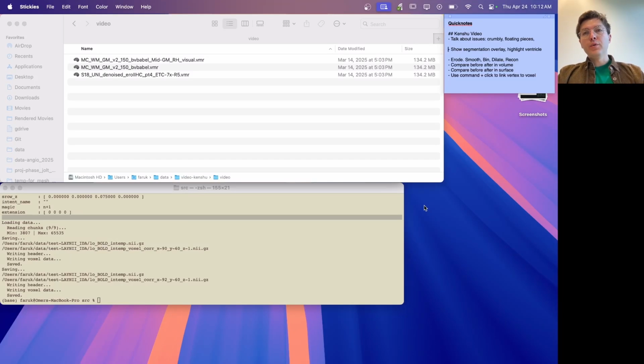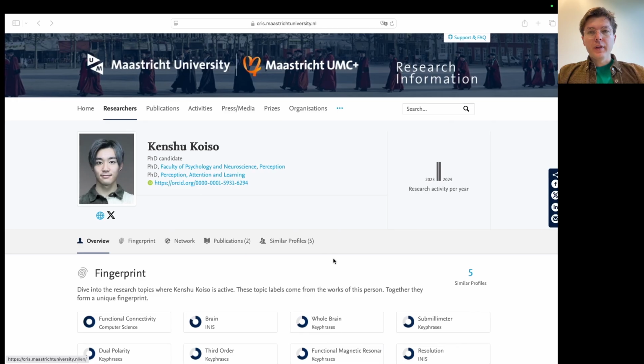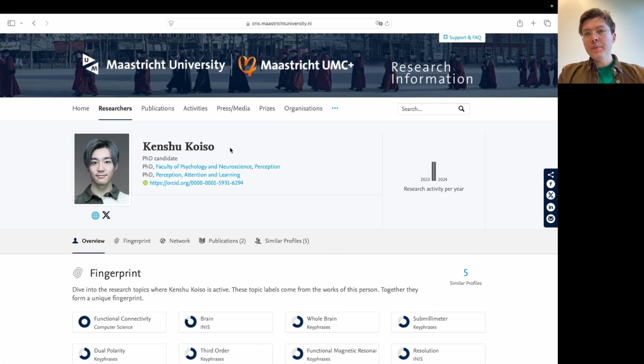Hello, today I'm going to talk about how to create a smoother looking mesh from a segmentation in Brain Voyager. This video is made to help my colleague Kenshu Koiso, who is a PhD student at Maastricht University in the Faculty of Psychology and Neuroscience Perception Group.